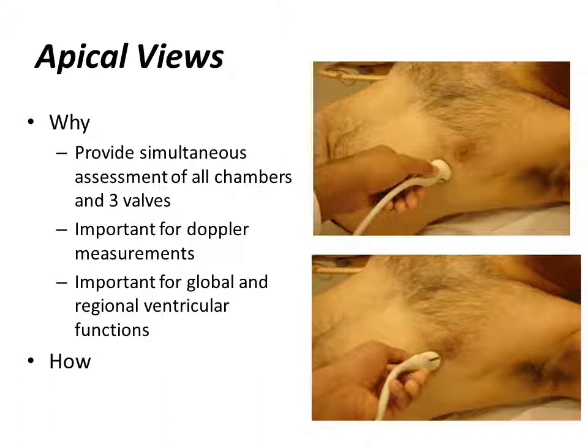So there is an apical 4-chamber view, an apical 3-chamber view, and an apical 2-chamber view. There is also a modification of the apical 4-chamber view called the apical 5-chamber view, which we'll discuss when we actually do this scenario.